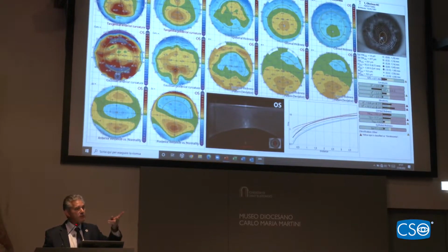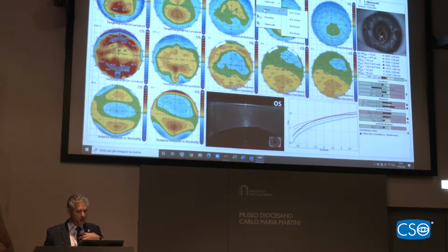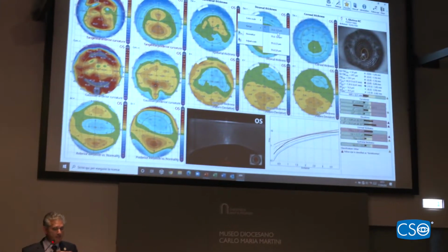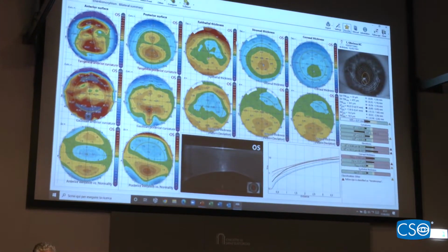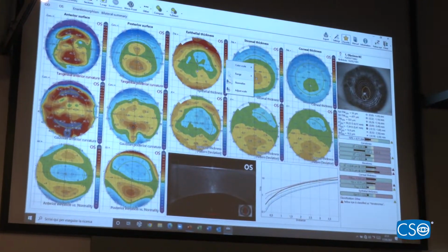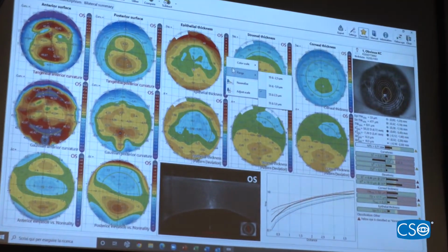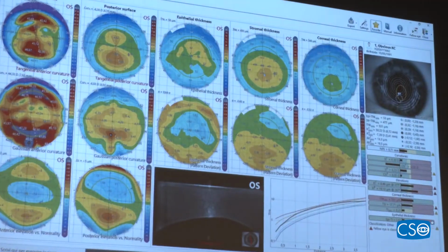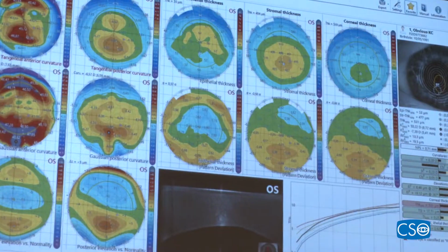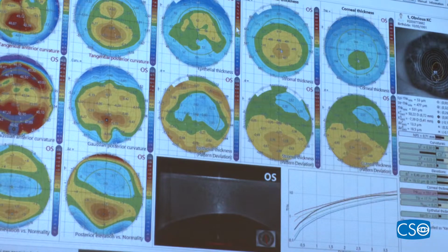And here we look at this on a reversed scale. So our range is set to minus 2.5 microns. Many people say, why don't you put it the other way around so that when it's thinner, it's red? And the answer is, since 1991, when the first map of the epithelium was done, I decided to use opposite scales so that you don't confuse curvature with thickness when you're looking at maps. And also, you get used to it very quickly.